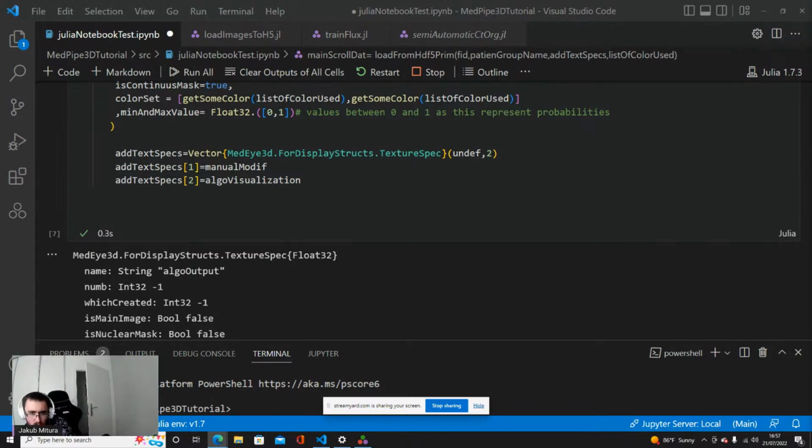Shader creation error. Oh, so this is related to some OpenGL problem. Are you using this on a laptop or on a PC? And do you have some GPU?